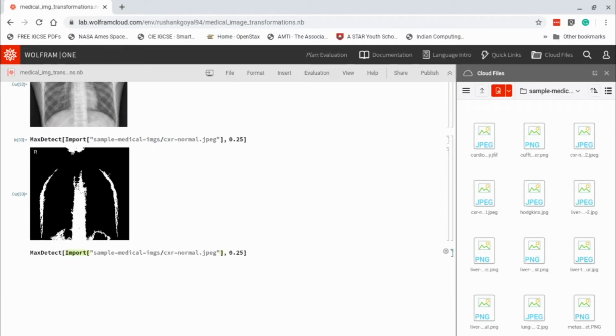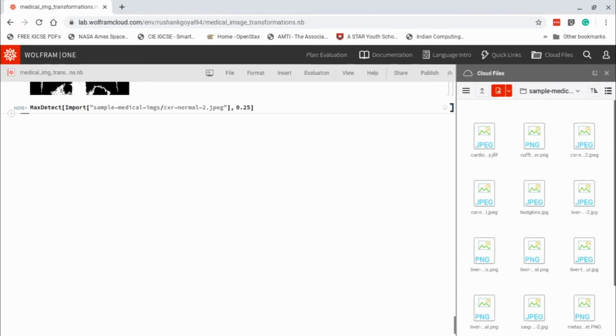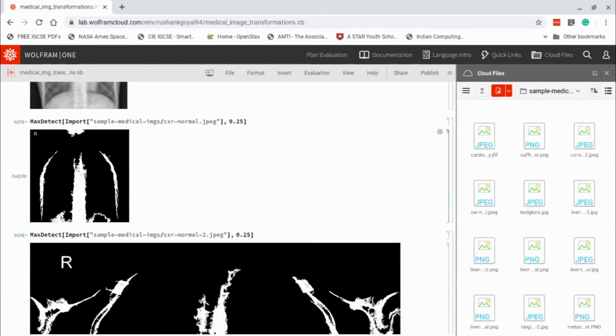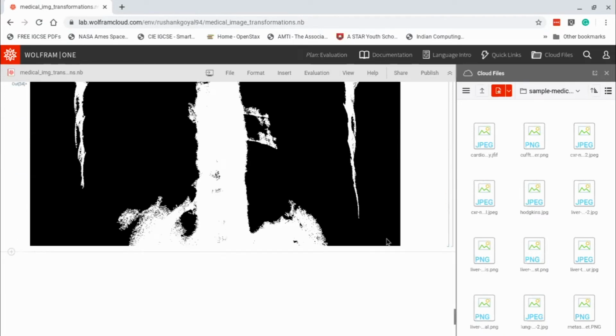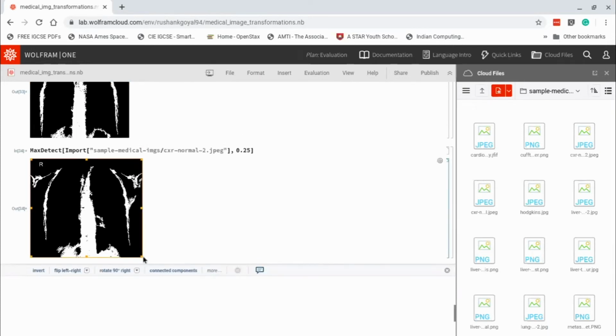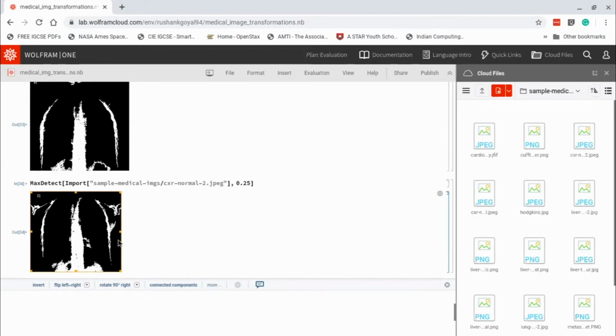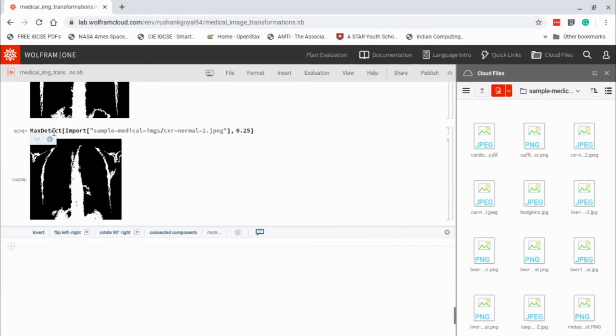And let's just apply this to the second normal image. So if you were an AI algorithm, you could see the similarity between these two, much better than you could see in the original image, because they both have this center area of white, which is the spine, and these ones on the end, which is the rib cage. The ribs. And so that makes it more obvious. And then the key thing you do is basically, I just copy this for cardiomegaly.